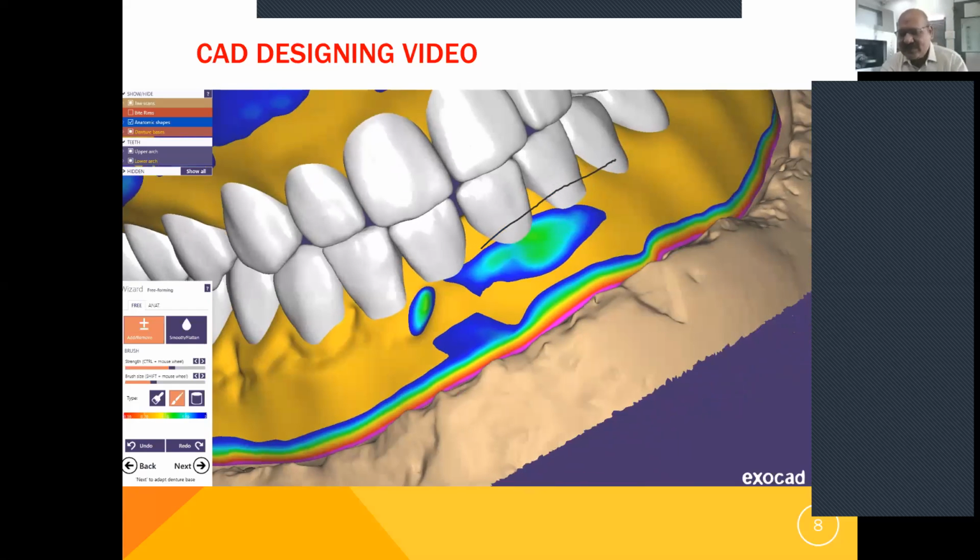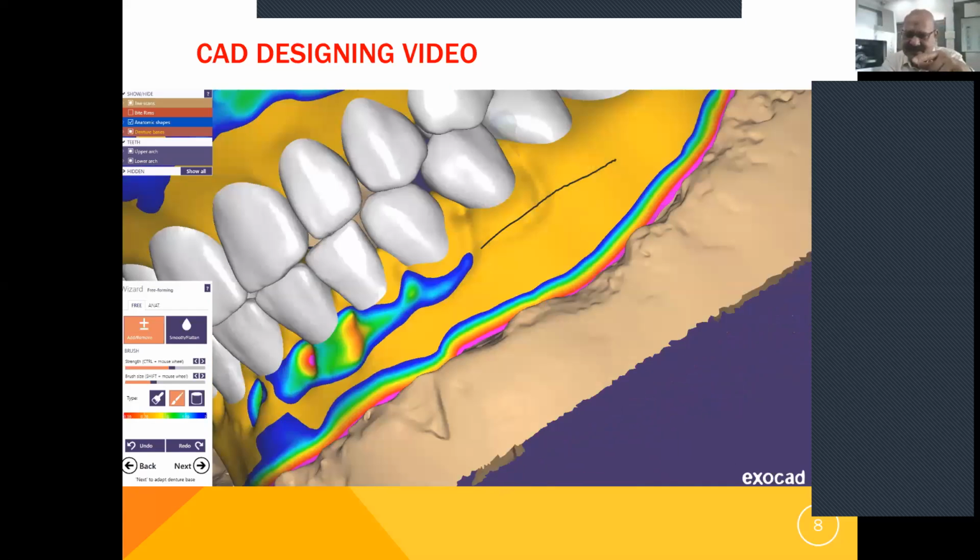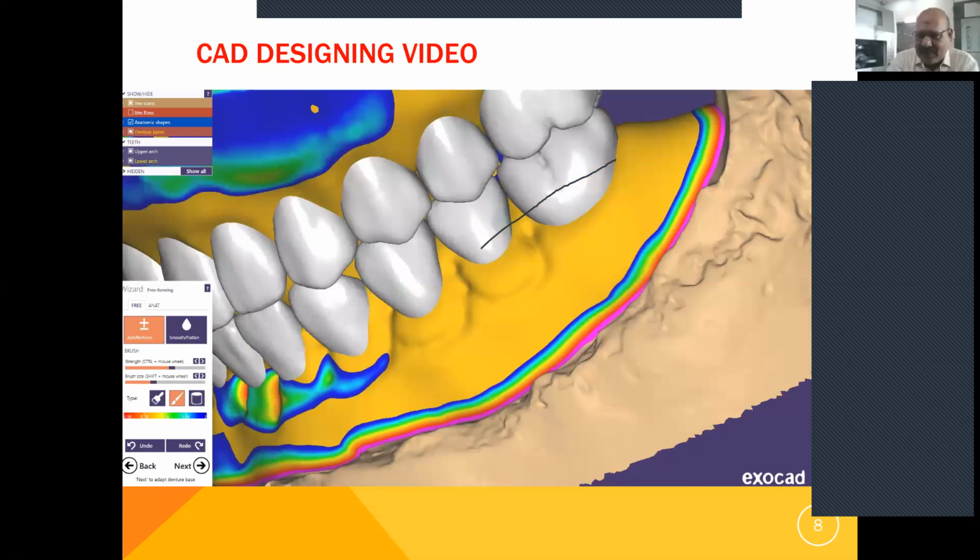Another good thing is, doctor, that with the use of composites, we can give characterization. Like we can enhance the aesthetics of this gingival area, like the papillae can be seen with some color effects, which I'll give you a picture of later.